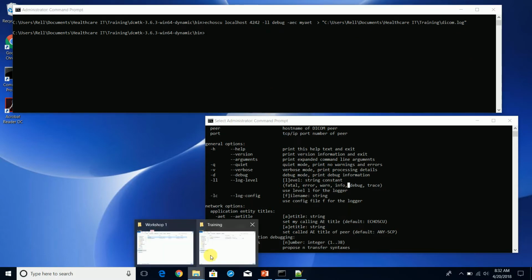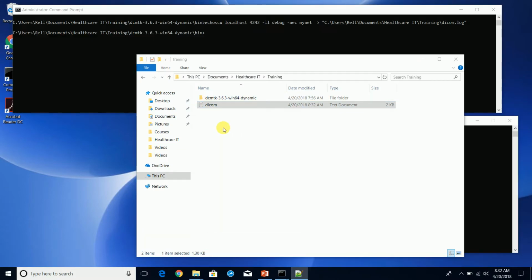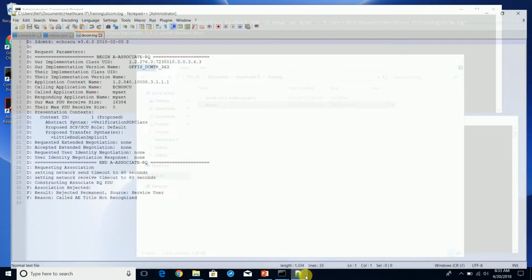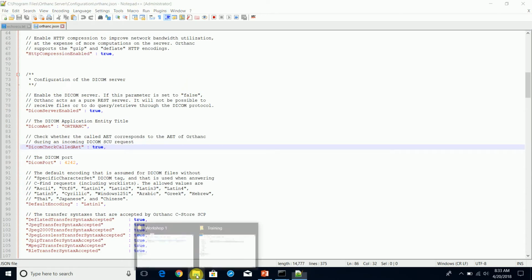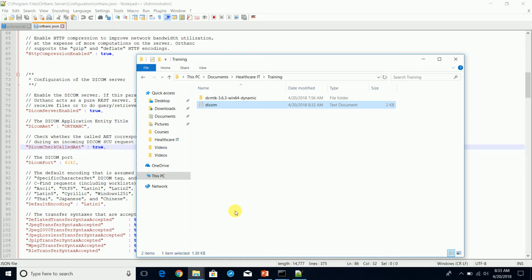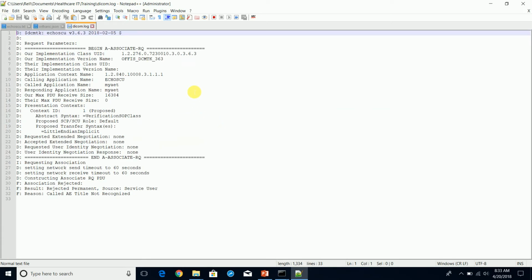Now if we go to the DICOM, we'll see that the calling, what we're using to call with, is Echoscu.